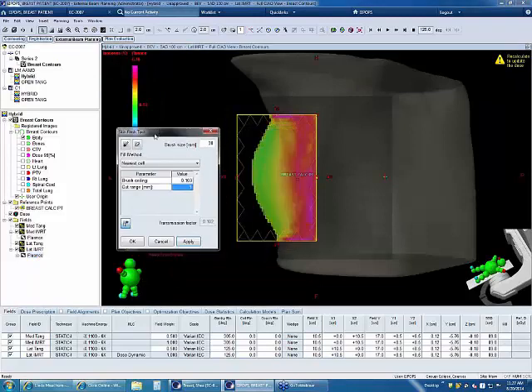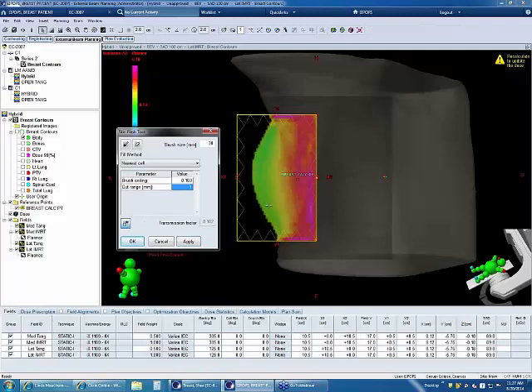I'm going to do the same thing. I'm just going to take my little transmission tool, and jump around in here looking at the transmission factors as they update. That's a little bit big. I'll keep this at about 0.104 this time.